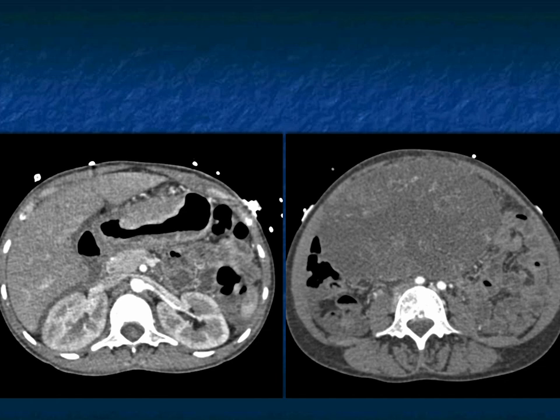You also see in the first image ascites, so the tumor has spread. Again, Mets is a possibility, and then you go down into the lower abdomen, and there's a large complex cystic mass. Now, what you can't say from this one image is, is the mass in the mesentery, or is it coming out of the pelvis? And I'm going to tell you this is coming out of the pelvis, and this was a female. So now you have a large pelvic mass, probably ovarian.